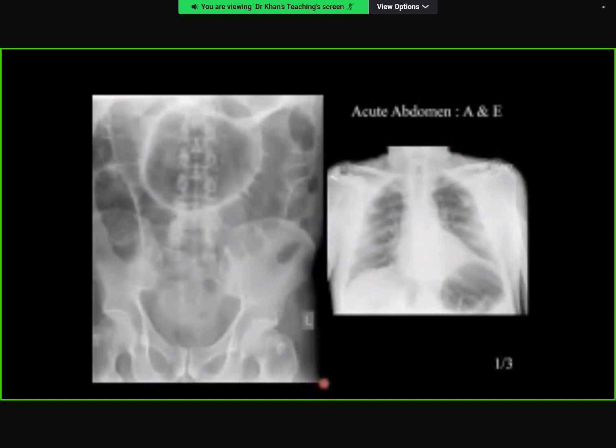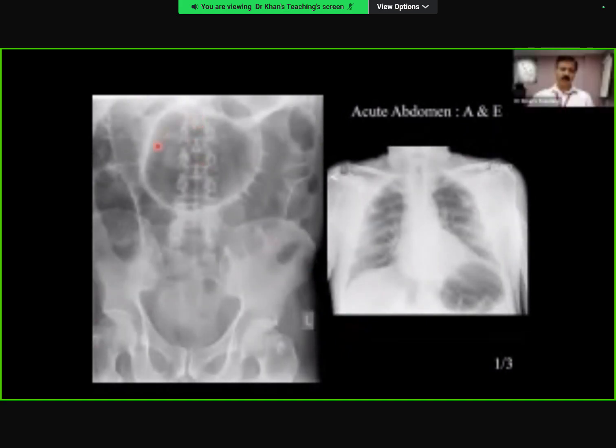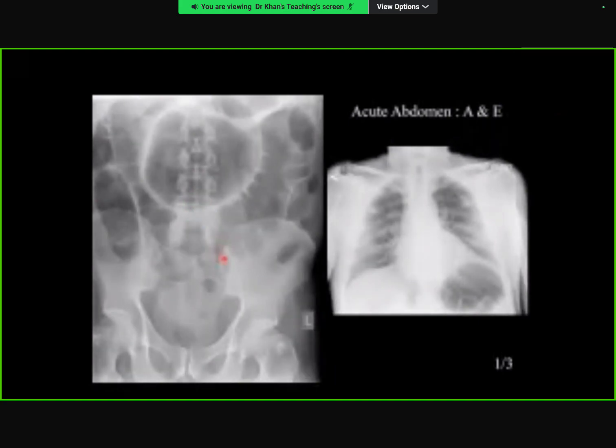However, I can see there's a dilated bowel in the abdomen. In the center of the abdomen, there's a round gas shadow. You have picked up this shadow. Well done. And there probably is a hint of Rigler sign adjacent to this shadow. Not convincing though.